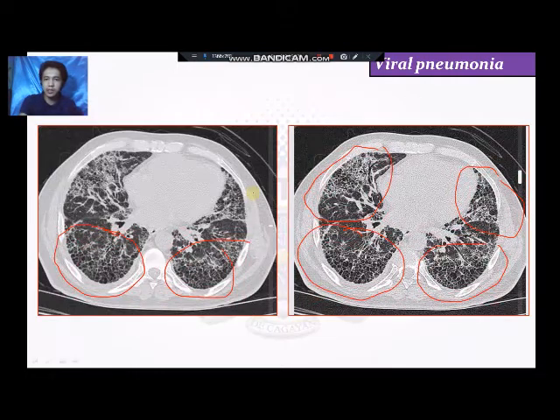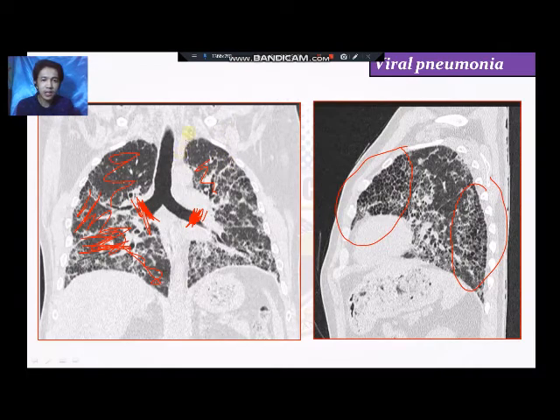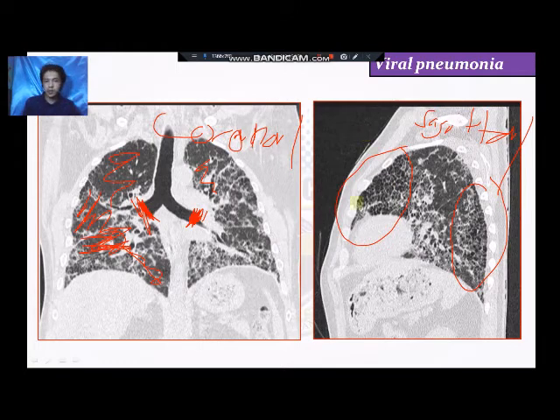Okay, so diba, na ay honeycomb gihapon nga formation. Okay, so this is a transverse cut or transverse nga section in CT scan. Then this is a coronal section, coronal cut, coronal, and then this one is the sagittal. Okay, so sagittal cut. Okay, similar sa inyong radaan, diba, you have the transverse plane, the coronal plane, the sagittal plane. So if ever ato tong gamiton ang mga plane in order for us to slice our patient, no, to represent the body of the patient in single slices, so nga ni ilang appearance.